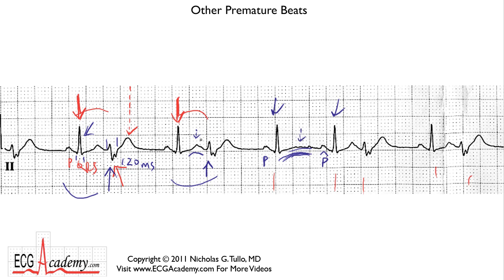Why? You guessed it. This is a P wave, and so is this. Well, you'd say, well, that looks like a normal T wave to me, but it looks different from this T wave. Okay? You have to compare from one T to the next. So now if you look at this T wave and you look at this T wave, you can see that this one's much more bumpy. There's a big giant lump on top of that. It looks like Mount Everest to me, and that's the P that results in this wide beat. And so what are these beats? These are known as aberrantly conducted APCs.